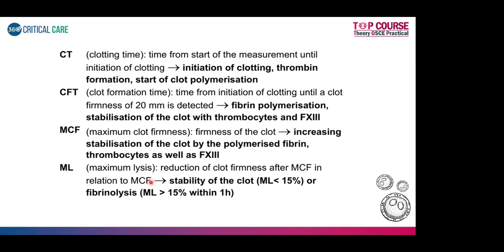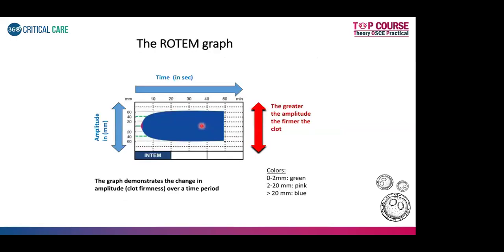And then lysis again gives you an idea about what is happening with the clot, whether it is stable or there is premature hyperfibrinolysis. So this is the first thing that you need to know. Similarly, you will have time on the x-axis and amplitude on the y-axis. Greater amplitude usually tells that the clot is firmer.